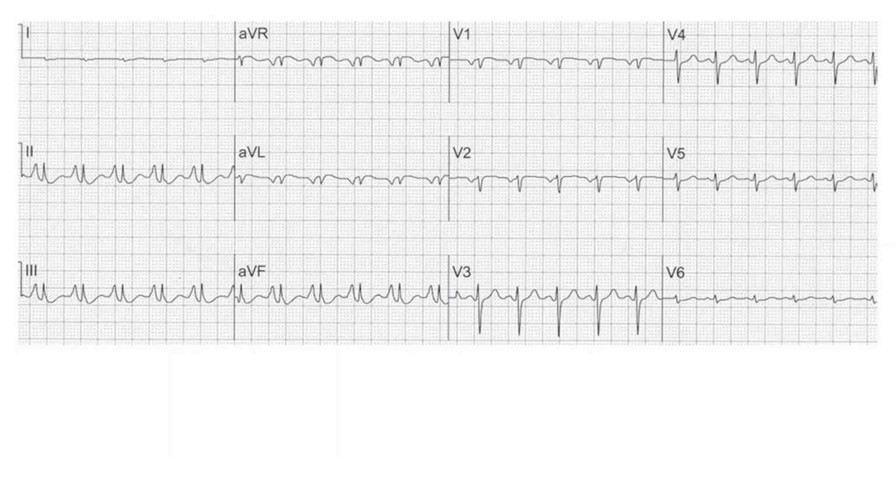The most difficult one I told is the type C. Here you can see R is definitely less than S. R is definitely less than S. But what you can appreciate is the lead 1 sign here. That means the lead 1 is like a straight line. So this is type C, which is classically described in COPD.